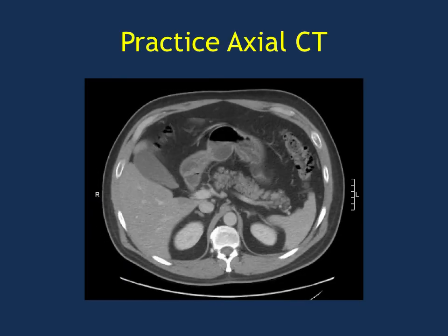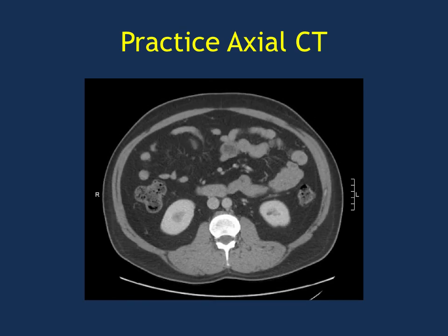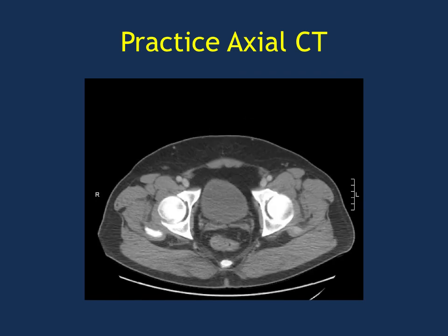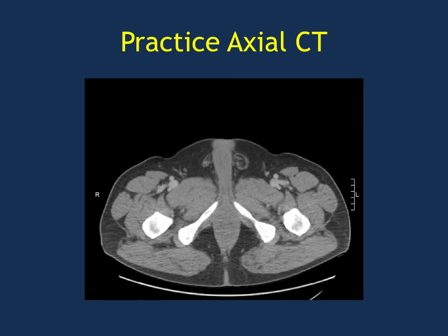And this is like a practice, as we discussed, right? I think it's really hard to look at scans without scrolling. I mean, it is a dynamic study, right? Yeah. So that's why we're providing you with these practice axial CTs for you to scroll back and forth on your own. And it's nice to get a system for yourself when you're practicing on things to look at, because just like chest x-rays, you're going to miss stuff that you're not looking for. So you want to focus on getting to each organ.